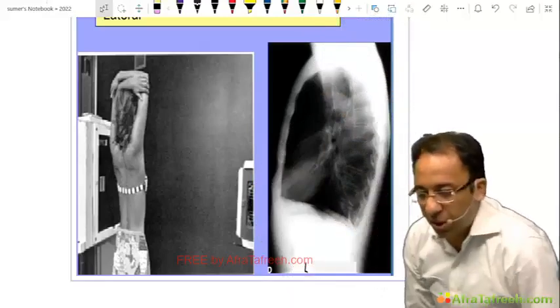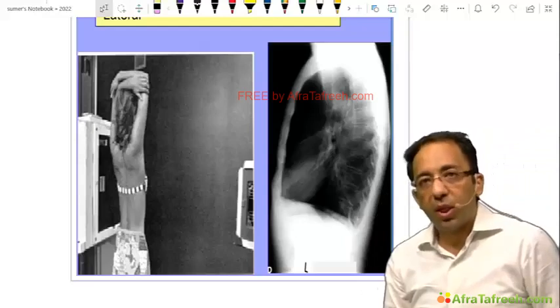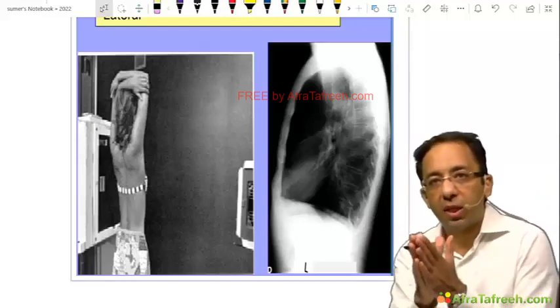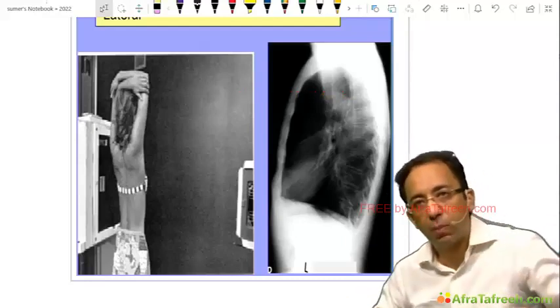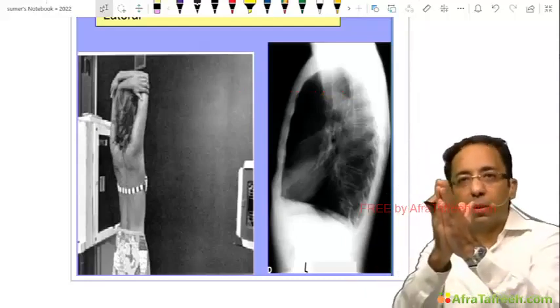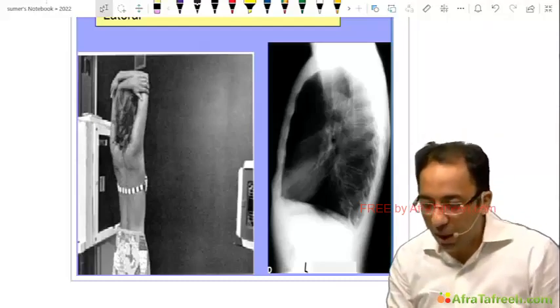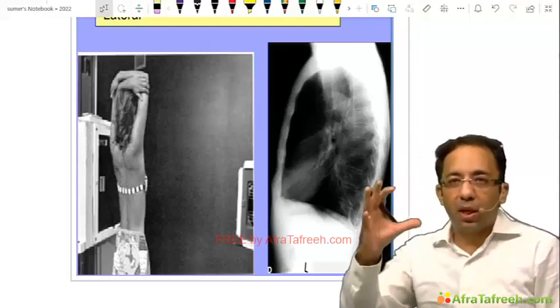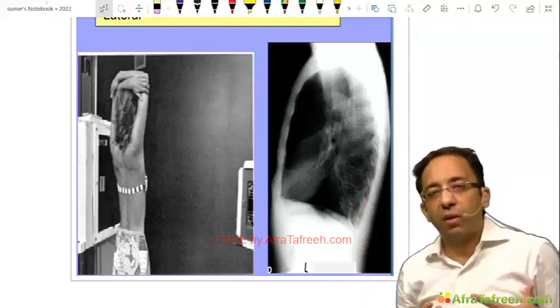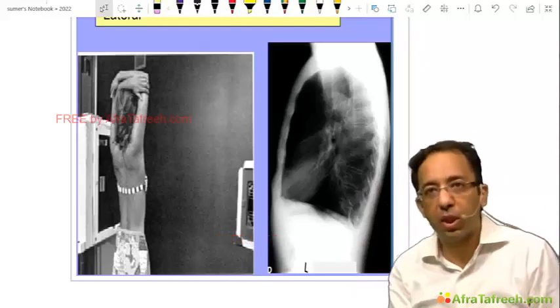Jivesh and Vinay, if you have a small pneumothorax, in full inspiration, sometimes it gets compressed. Pneumothorax is where? In the pleural space. If the lung is fully expanded, we may not be able to appreciate it. I'm again repeating. A small pneumothorax might be compressed in a fully inflated lung field, so we may miss it. So it is better to see it when the lungs are collapsed in expiration.